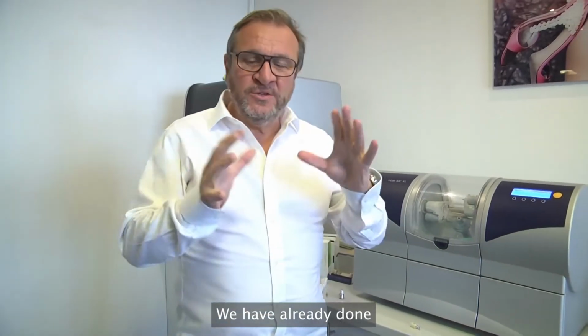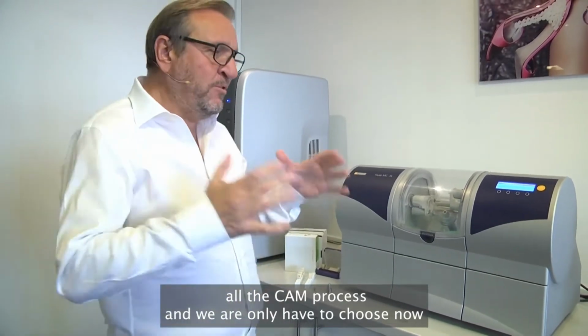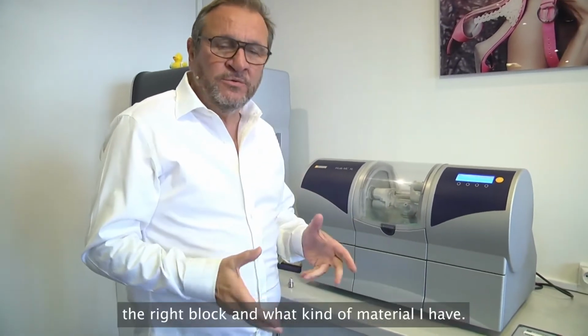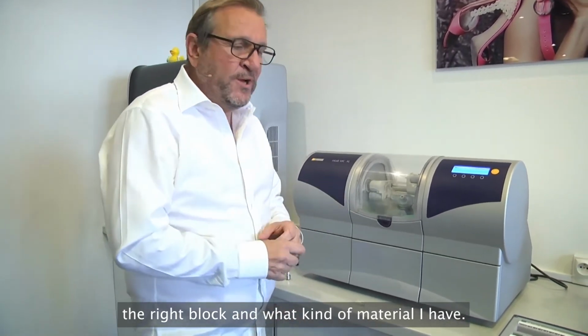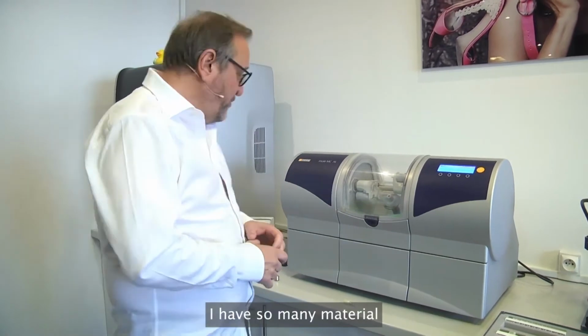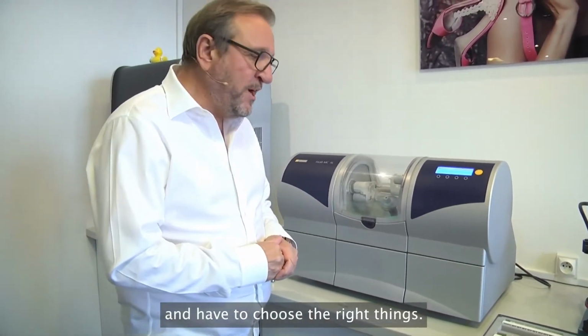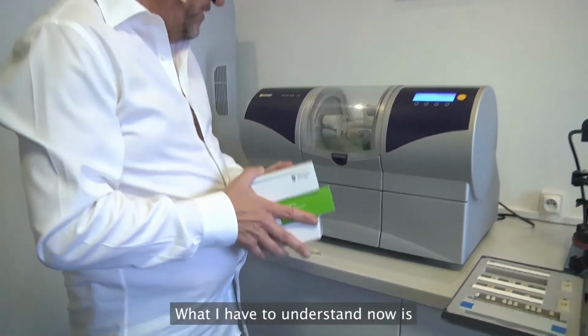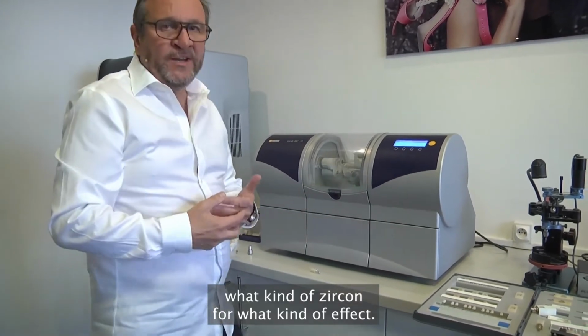We have already done all the CAM process, and we only have to choose now the right block and what kind of material I have. I have so many materials and have to choose the right ones. What I have to understand now is what kind of zircon for what kind of effect.